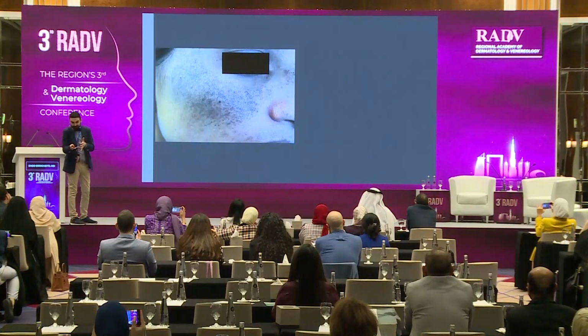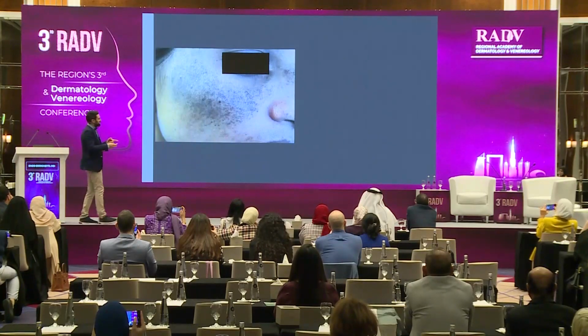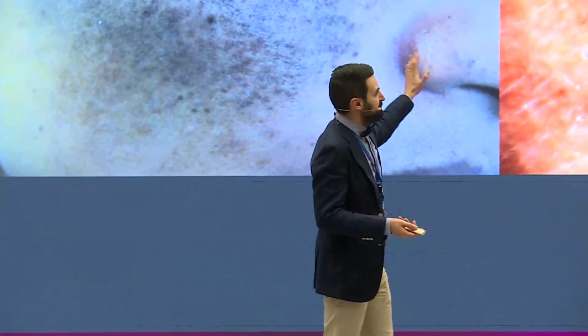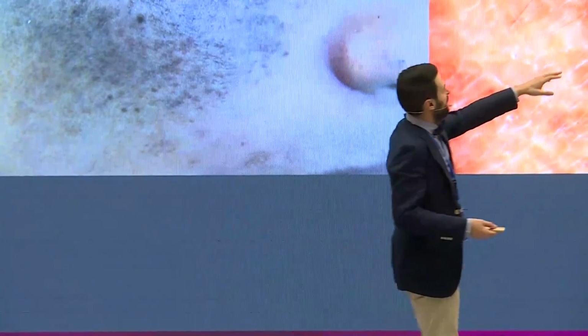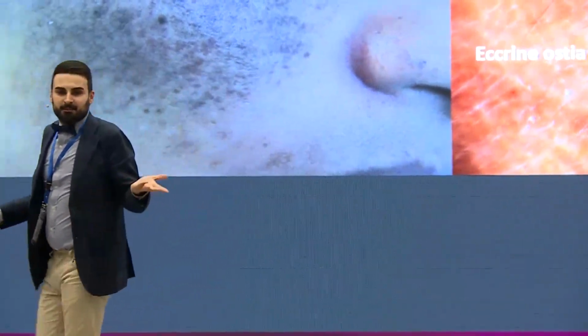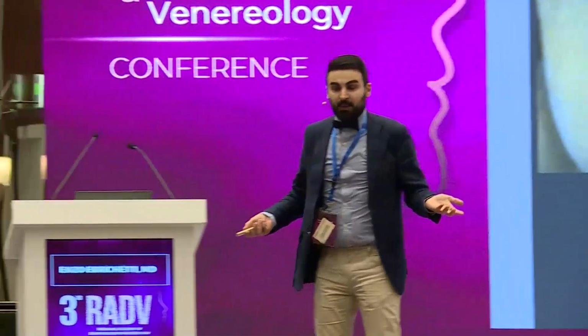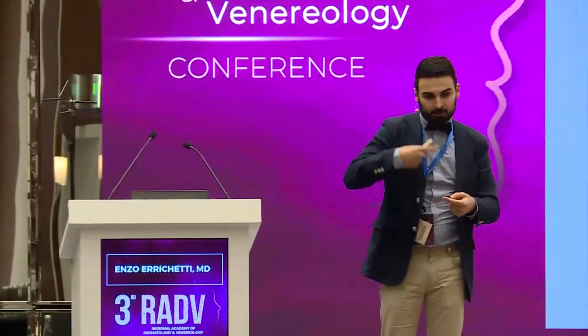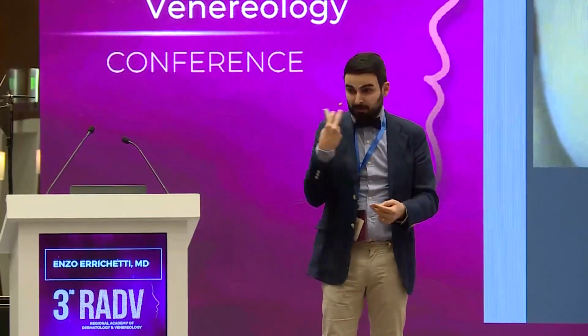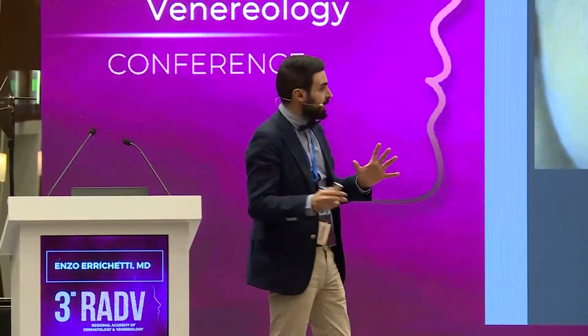Exogenous ochronosis, are you sure? Do you see any circles and semicircles? No. We have brown pigmentation with ostial obliteration, okay? So, correct, it's nevus of Ota. And we have to remember that nevus of Ota may also arise in old age, and it may also be bilateral. So it's not so simple, the diagnosis.